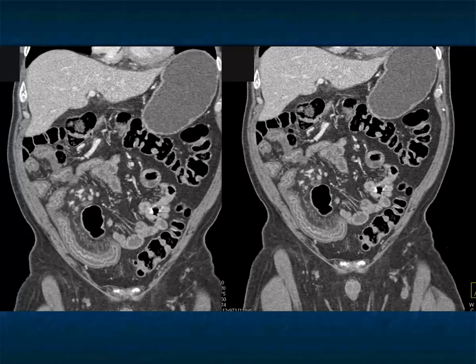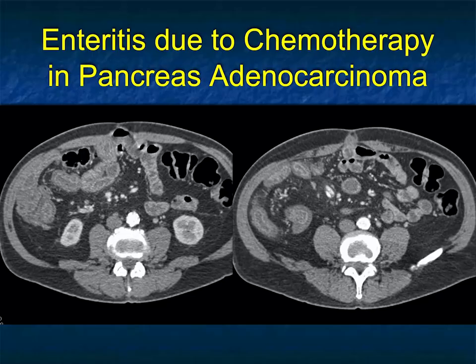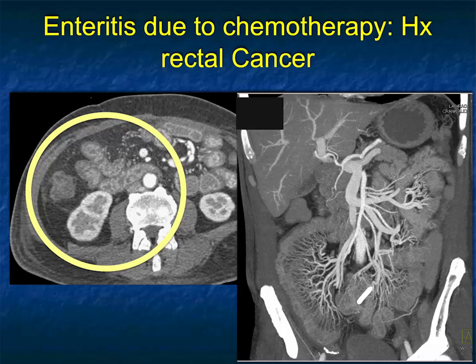Again, you might think of the other possibilities from chemotherapy. This was not a case of graft versus host disease, but infectious, inflammatory ischemia. But again, therapy, and this could be radiation if radiation was done, but clinical history said there was no radiation. This was due to chemotherapy. So chemotherapy can yield enteritis, can be fairly extensive or fairly focal, and can be a very challenging diagnosis.